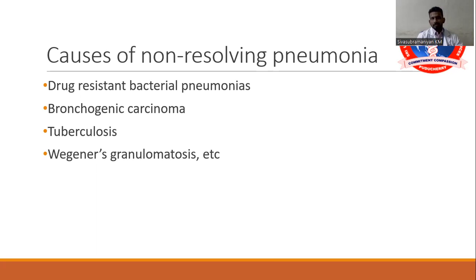A bronchogenic carcinoma also resembles a patchy pneumonia on the radiograph. A key point is that bronchogenic carcinoma will not resolve with any antibiotic therapy, whether it is resistant or not. There will not be an interval reduction in the size or extent of the opacity. There will either be a stable opacity or a gradually progressing opacity, and that should give a suspicion of bronchogenic carcinoma.